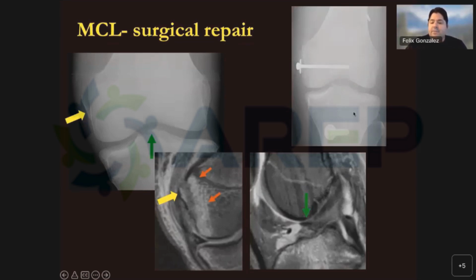And this is how it was fixed. Here's a single orthopedic screw fixating that displaced medial femoral condyle fragment. And this is an additional screw, basically taking care of the attachment onto the tibial platform, tibial eminence, I'm sorry, of the ACL attachment right there.